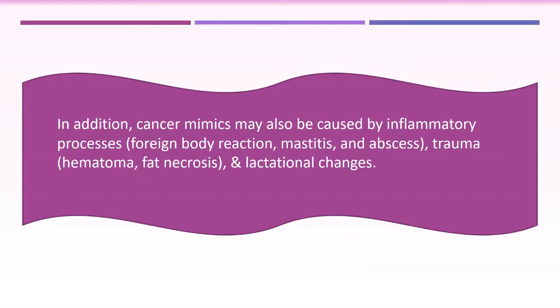Implants rupture, a silicone granuloma. What about sutures? You haven't seen suture calcifications?